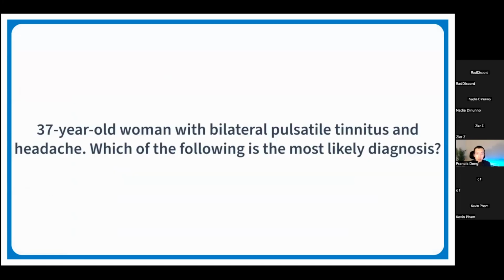A 37-year-old woman with bilateral pulsatile tinnitus and headache. Which of the following is the most likely diagnosis?